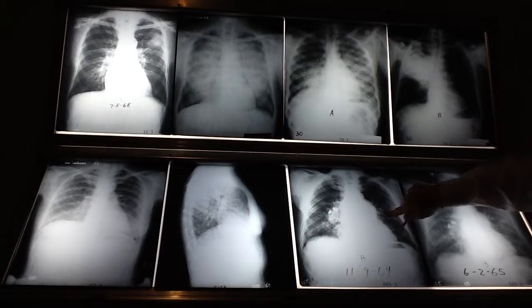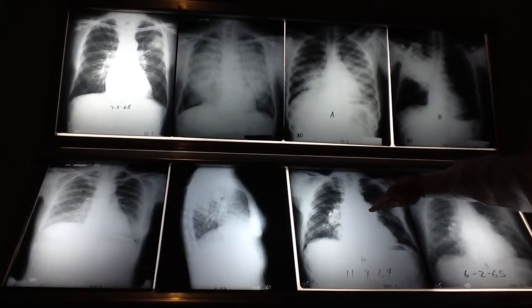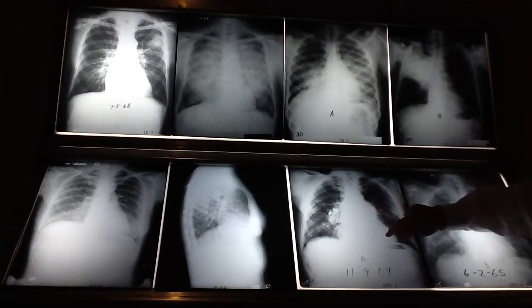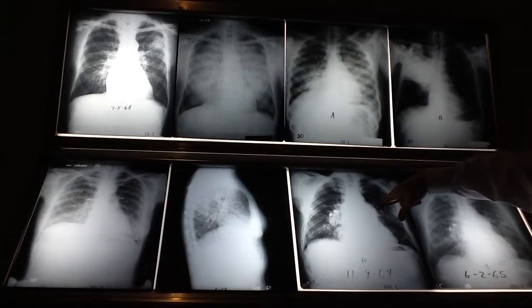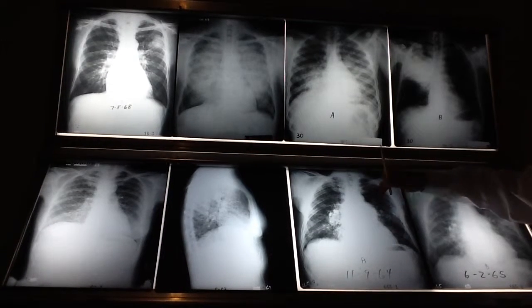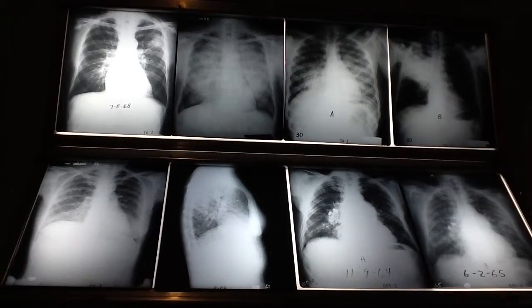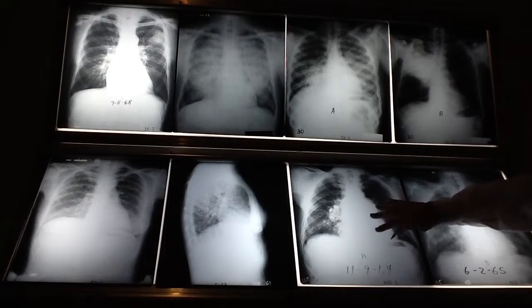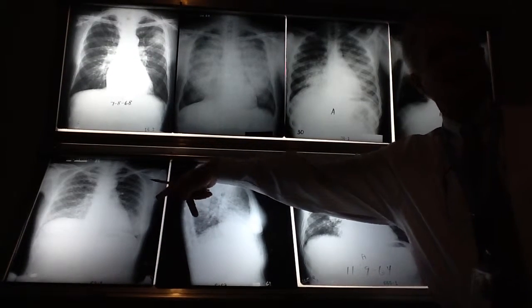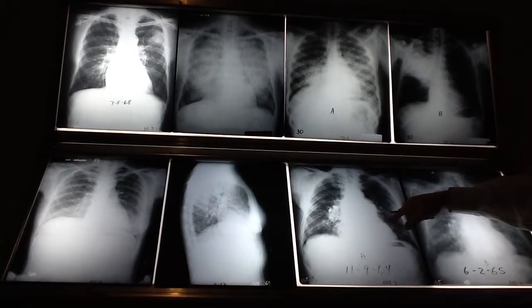This is cor pulmonale. And what chamber's pushing blood through that big blood vessel? Right ventricle. And cor pulmonale is right ventricle failure because of lung disease. And the 2 main conditions that cause cor pulmonale are widespread fibrosis and emphysema. Those are the 2 main cor pulmonale disorders. And this is permanent. This can still go back to normal. This is an active interstitial pattern. Now this may end up like this if the patient's unlucky.